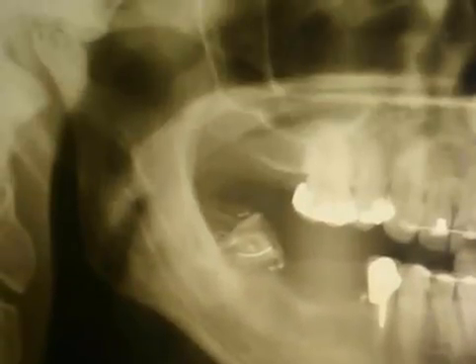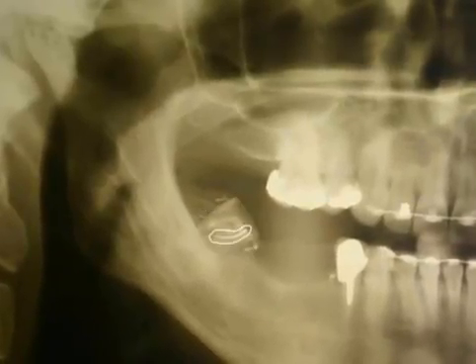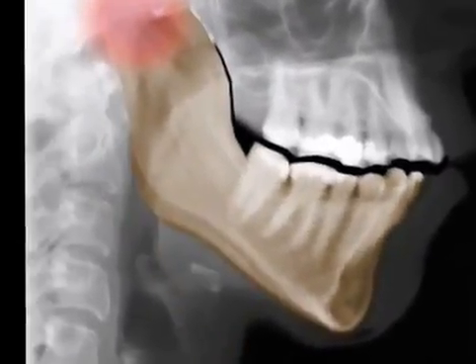This patient has been missing side teeth for years. She came in with pains in the jaw joint. A little bit of the root is left. The front root has been filled up completely, the back root partially, root treatment. The jaw joint is irregularly spaced, the cleft narrowed, and an irregular pattern can be seen in the gap. These are the classic signs of jaw arthrosis. The strain of chewing was not borne by the teeth but by the jaw. Over the years, this led to arthrosis.